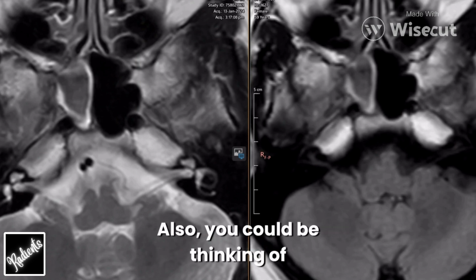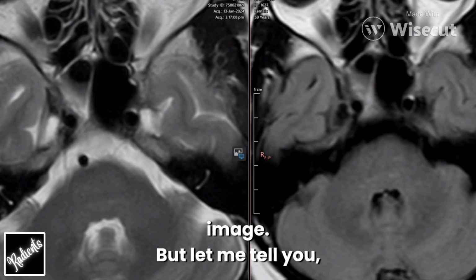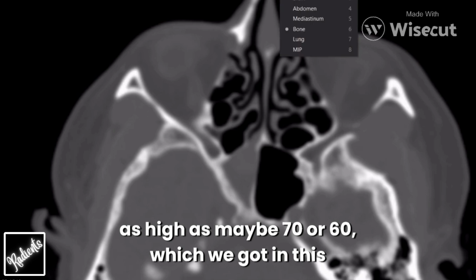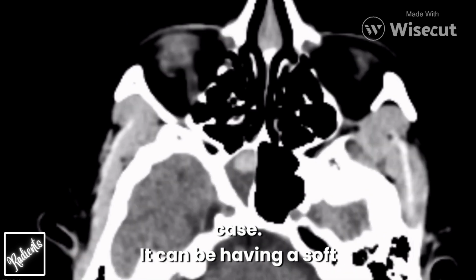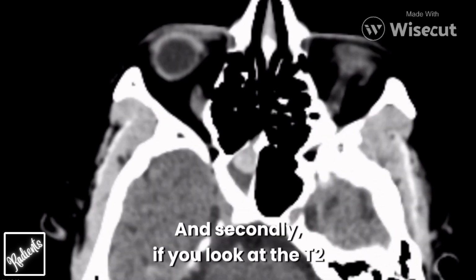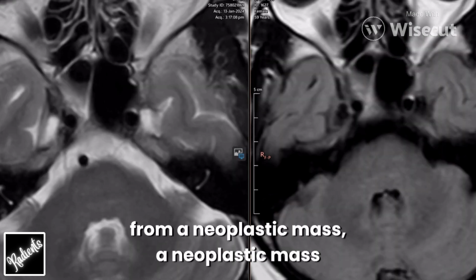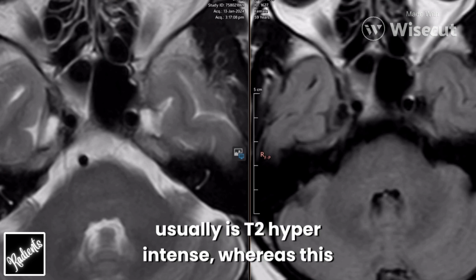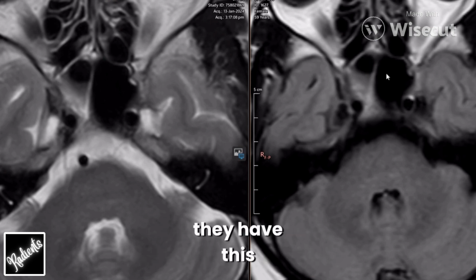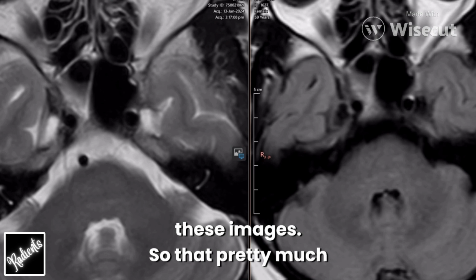Also, you could be thinking of another neoplastic mass inside the sphenoid sinus when you looked at the CT scan image. But let me tell you, neoplastic masses usually do not have an HU as high as maybe 70 or 60, which we got in this case. It can be having a soft tissue density around 30, 40, maybe even 50, but usually it doesn't go beyond that. And secondly, if you look at the T2 weighted image, which is more helpful in differentiating it from a neoplastic mass, a neoplastic mass usually is T2 hyperintense, whereas this lesion, because of its fungal elements which have different magnetic property, they have this characteristic T2 hypointensity on these images. So that pretty much helps us.